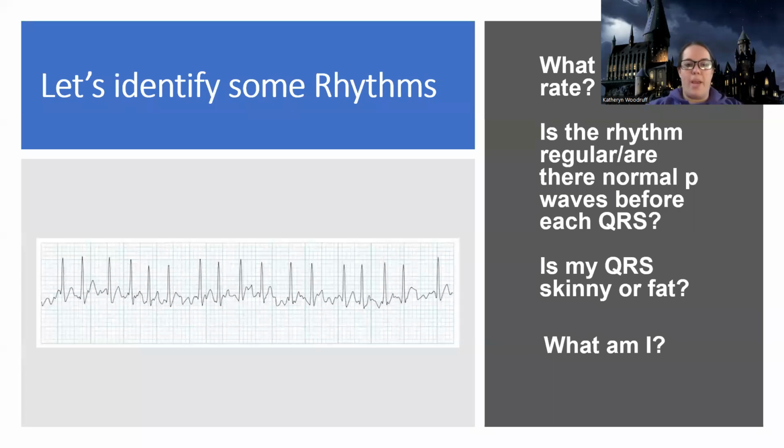Hey guys, so we made it through the systematic method, but now let's bring it all together and see if we can answer it all about one rhythm. Let's actually figure out what the rhythm is, because before we were just breaking down the pieces.